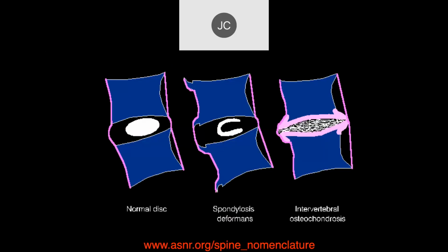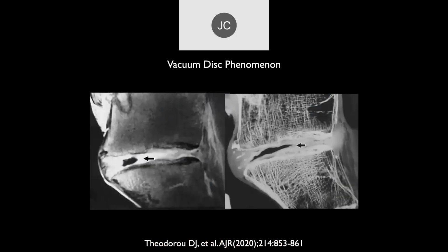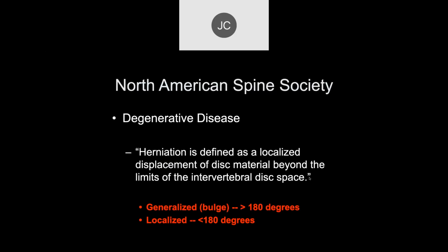And there have been people that have commented on different nomenclature for degenerative disc disease. I don't use this. I don't recommend it. It's just more severe degenerative disease, and I think these terms are more confusing than they are helpful. And this is just kind of what severe degenerative disc disease looks like on MR examination, and then this is the cross-sectional CT.